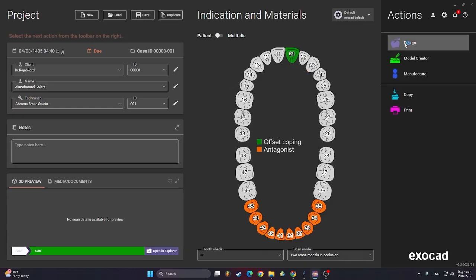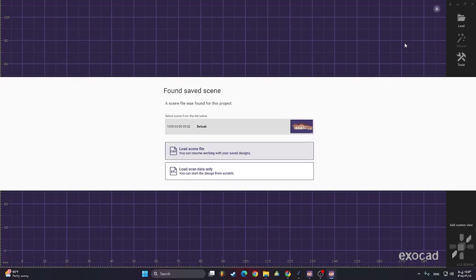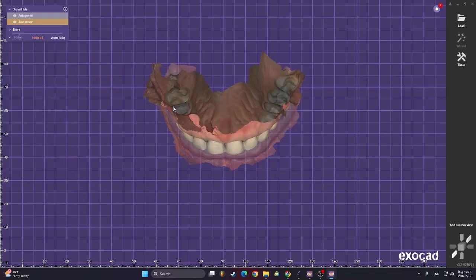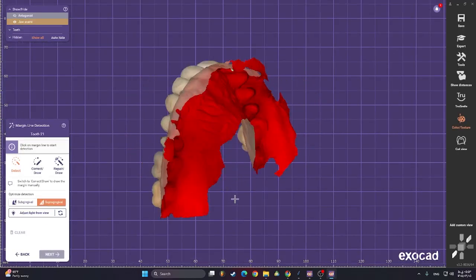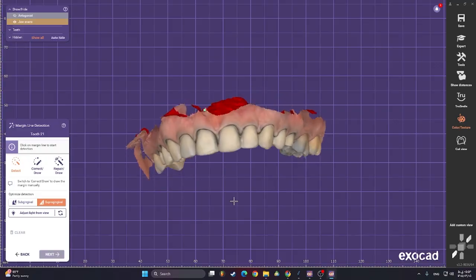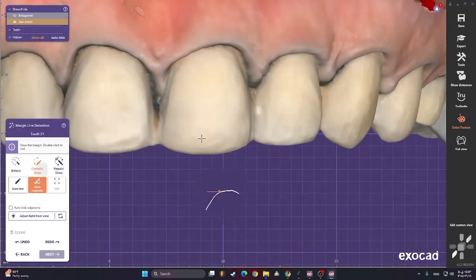I will show you how to design a well-structured central crown framework and explain how it can significantly improve the porcelain layering process, making it easier to achieve both strength and aesthetic results. As in any other restoration design workflow, we begin by defining the margin line accurately.